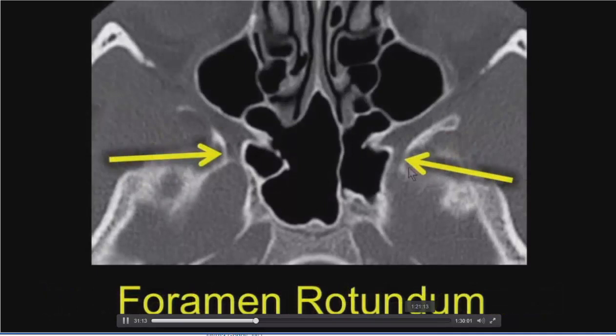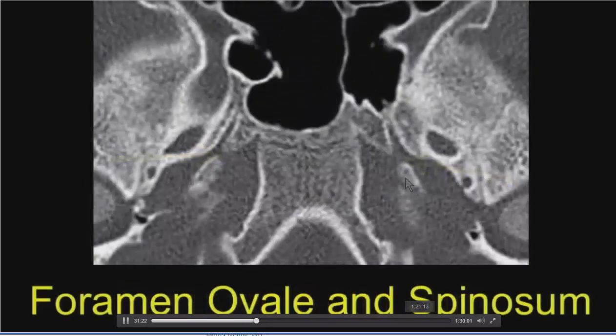And foramen rotundum, as you heard, this is a view in the axial section, so round in the coronal plane, as you just heard in the prior talk. This is foramen rotundum where V2 is going through. And here we have the high-heeled footprint of the skull base.